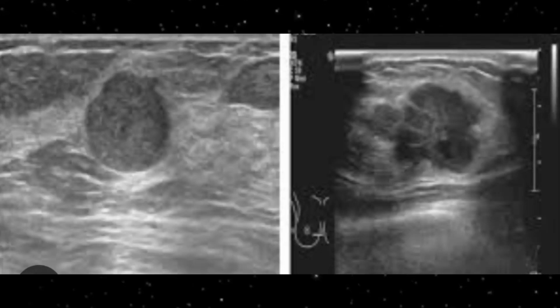and malignant respectively. With respect to benign and malignant lesions on ultrasound imaging, the next important factor is the posterior effects. You have to look for the posterior effects, and if there is minimum attenuation and posterior enhancement, it will show that the lesion is benign. But if the attenuation is obscuring the posterior margins of the lesion, this would more likely be a malignant lesion.